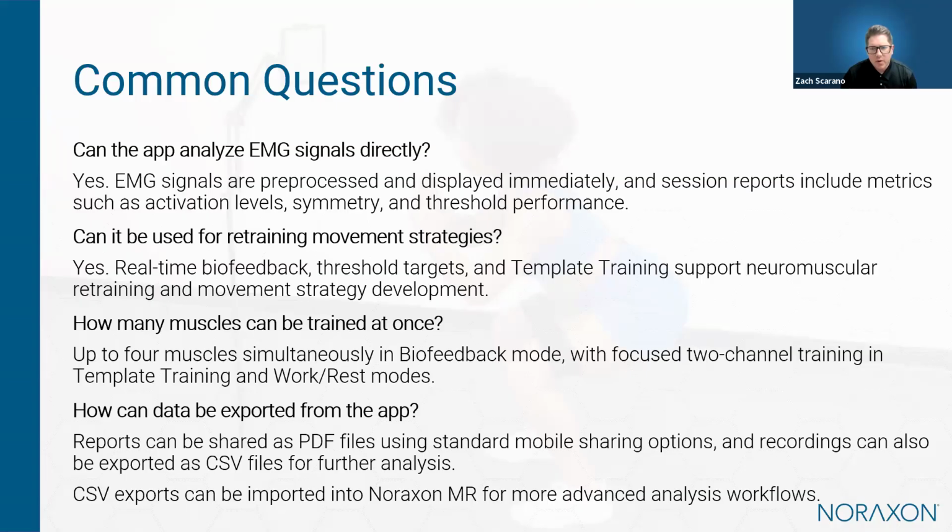We also received a question about how many muscles can be trained simultaneously. In biofeedback mode, the app supports up to 4 EMG channels, allowing users to monitor and train multiple muscles during a task. Template training and work rest modes use 2 channels for a more focused training.